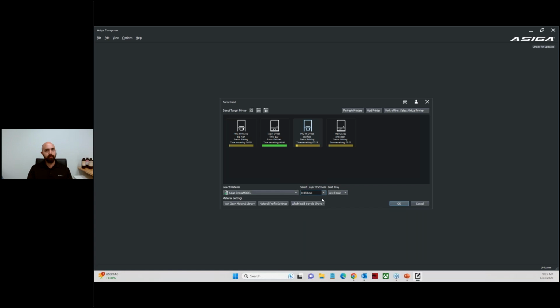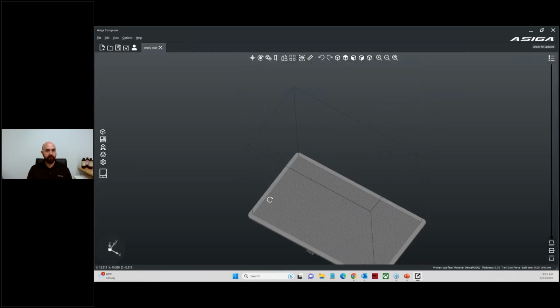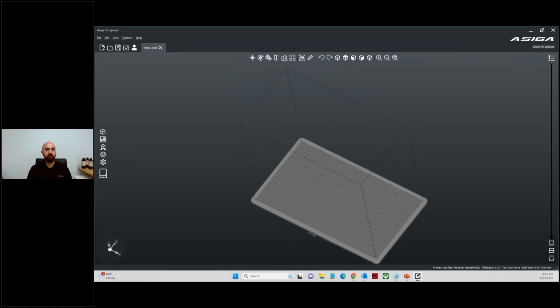So rule of thumb for layer thickness is anything that's fixed prosthetics, you'll want to print in 50 micron layers. Anything that's removable prosthetics, 100 micron layers. Orthodontics or even digital dentures, 100 micron layers is sufficient for that. But for models, specifically dental models for fixed prosthetics, I'm going to go ahead and keep at 50 micron layers.